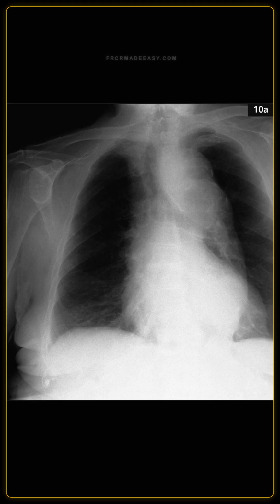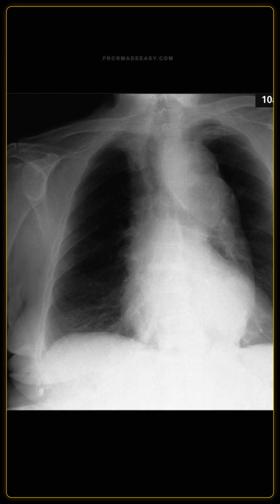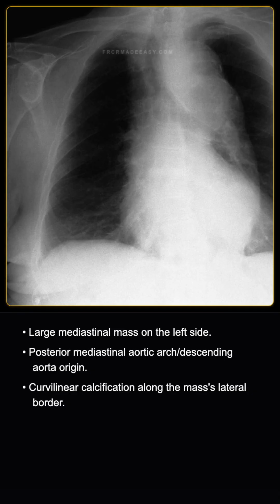A 76-year-old male presented with chest pain. I am showing you his chest radiograph. Describe the findings. Right, so the AP chest radiograph demonstrates a large mediastinal mass on the left.